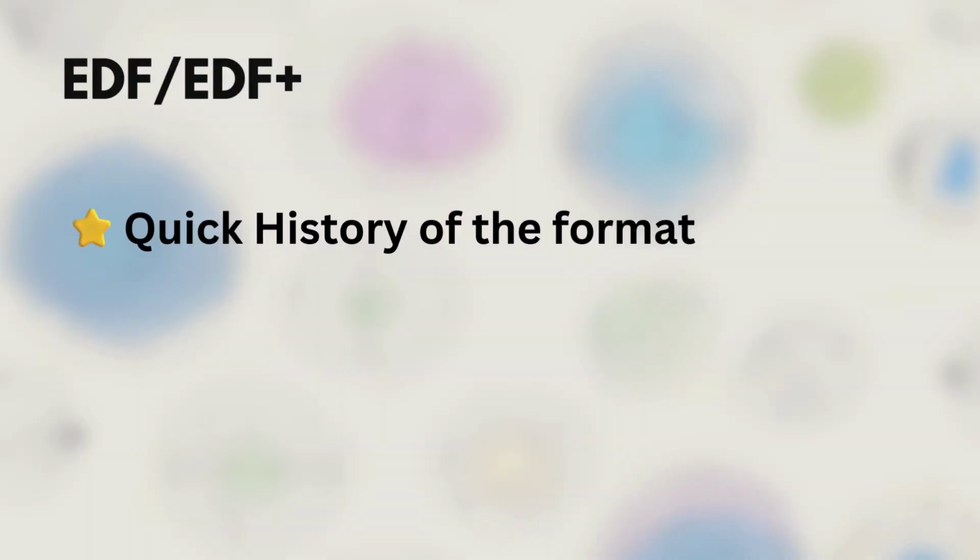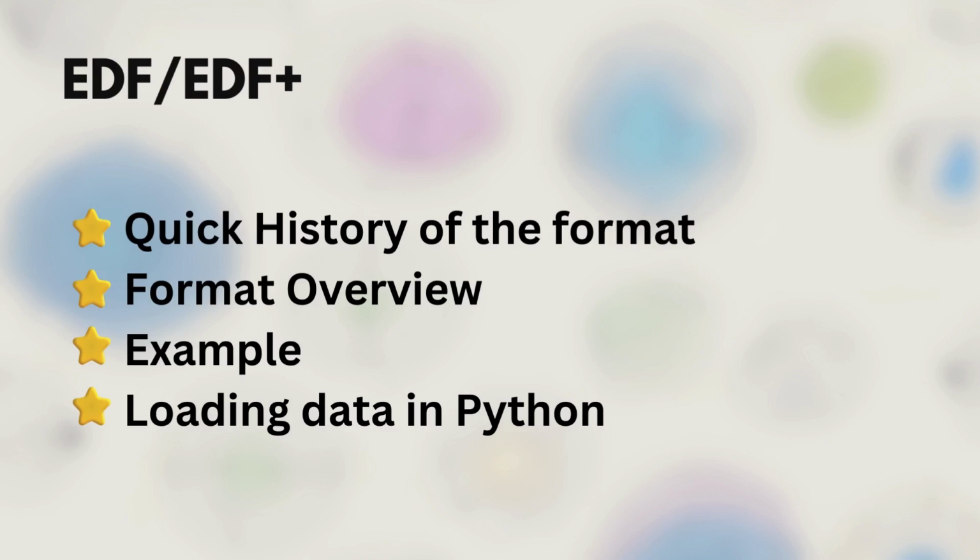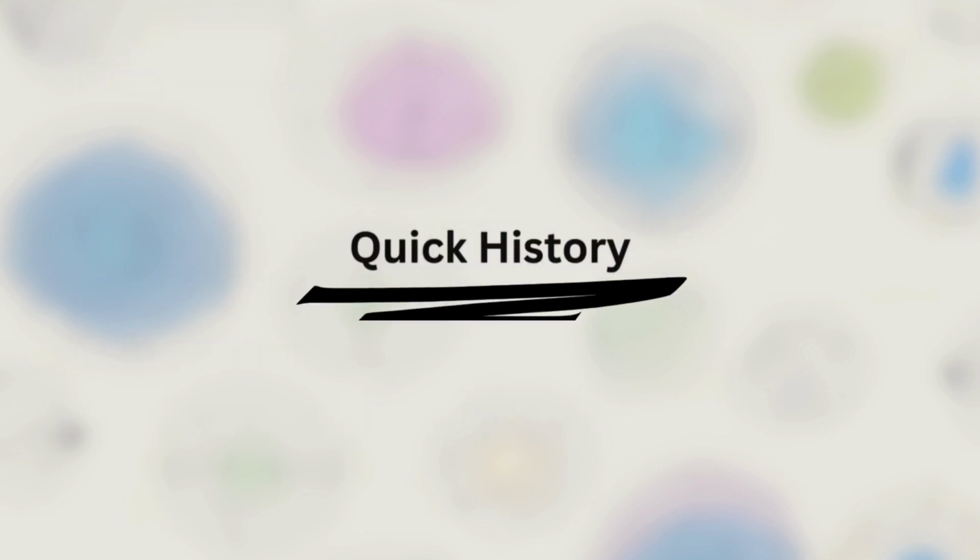We'll first go through a quick history of the format, which gives good insight into its underlying structure. We'll then check out a high-level overview of these two formats. We'll then open up an EDF file and check out what the raw information looks like. And finally, we'll jump into a notebook to open this type of format programmatically and start analyzing them. Let's start with how this format came to be.